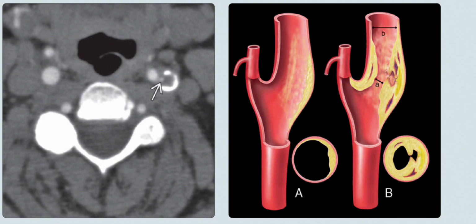The left image is the axial CT angiography, and it shows a severe stenosis of the proximal left internal carotid artery with a small residual lumen. Also noted are the typical peripheral mural calcification and the lower density lipid-rich core of the more central soft plaque in the left internal carotid artery.